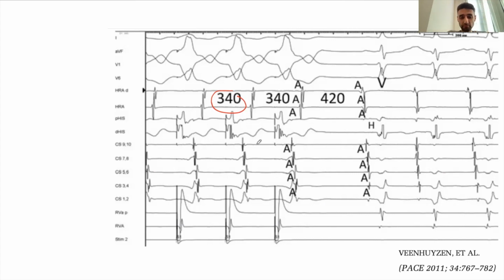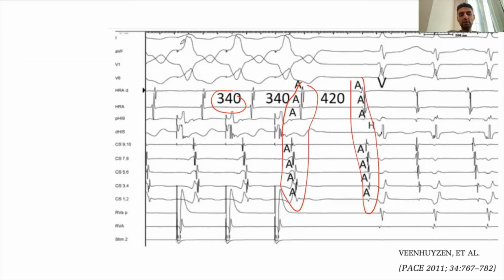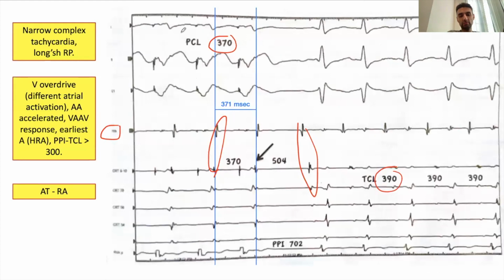And then the atrial activation during pacing is definitely different than your atrial activation during tachycardia. Okay, so there's a VAAV response after pacing had been stopped, and when you pace, the QRS complex looks very wide. Okay, so it's not suggestive of fusion. Similarly here, by the way.